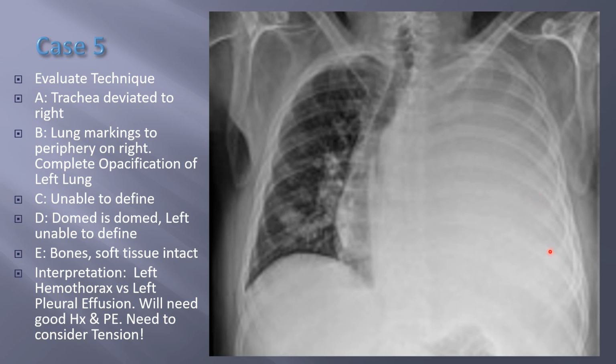If this patient had fallen, you might not want to stick a chest tube in there right away to drain all this, because he might be on blood thinners for some reason, and this might be kind of tamponading itself off, meaning it's kind of bled into his chest, but now it's kind of filling up and it's hard to bleed more. But this is also a lot of blood. Like for acute blood loss to fill up your chest, this patient's in big time trouble. So you need to kind of consider a little bit of what's going on.